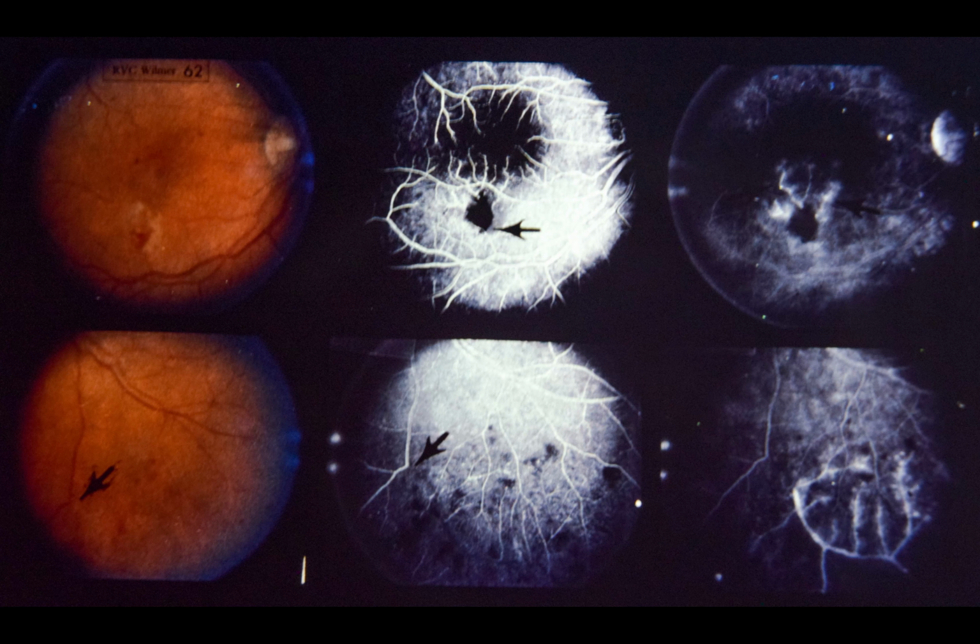Upper center, note that cotton wool spot and hemorrhage obstruct background choroidal fluorescence. Arrow points to occlusion of retinal venule draining inferior macula. Upper right, 5 minutes after injection, note staining of and leakage from terminal branches of the obstructed venule due to hypoxic damage to its endothelium.